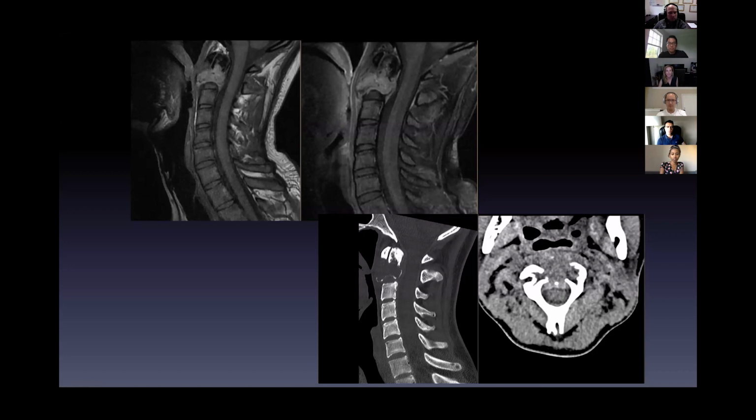Melanoma. Anyone? I think it's important to talk to the patients here. To the points that have been made, when you calculate this on a SIN score, this is certainly not high. Low, right? But based on the appearance of it, I certainly worry about the long-term structural integrity. So I think you can talk to the patients about the pros and cons of watching versus surgery, but this is something that would certainly make me quite nervous. Okay. Anybody else on that one?